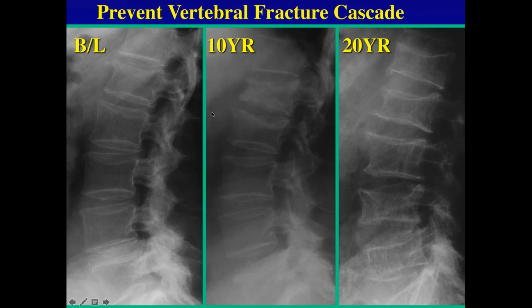I'd like to point out an interesting feature here in this mild fracture going on to a severe fracture. At this time, we see a fair amount of sclerosis of the end plates extending into the vertebral body, and that typically is an indication of a relatively recent fracture, that is within, say, some months to perhaps a year, because over time the callus formation and reparative process stabilizes and you lose that. So this is one way that you can occasionally tell that a fracture is old versus a subacute fracture, as we see here. It's not entirely reliable, but it's something to be mindful of.